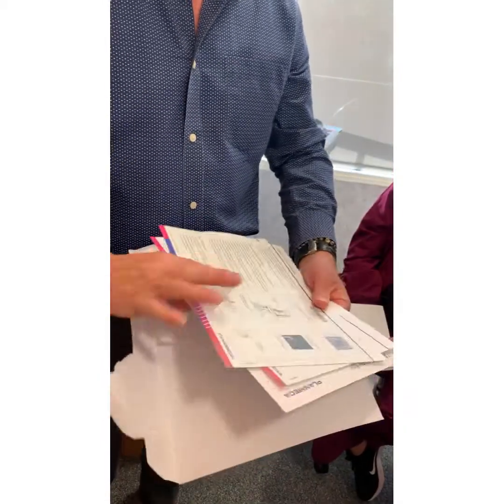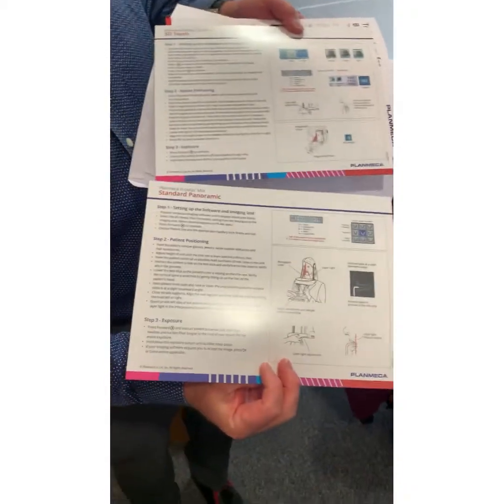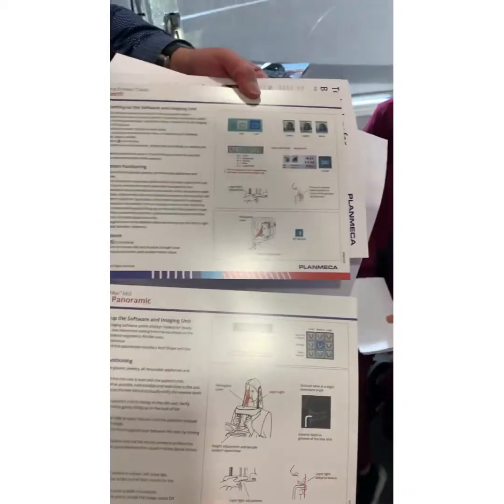New sheets. Everything that I've said is on this sheet. It's laminated. If you get schmutz on it, you can sponge it off. Don't move it. And there's 3D as well. Taking a picture of it. Smart pan. Yep, smart pan.